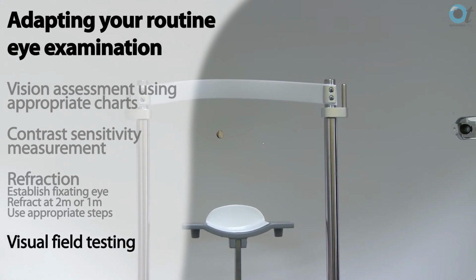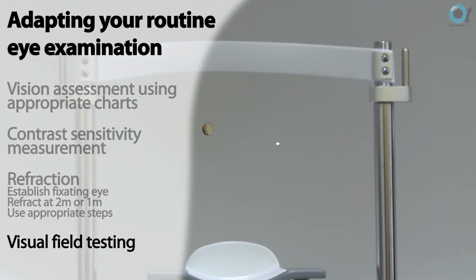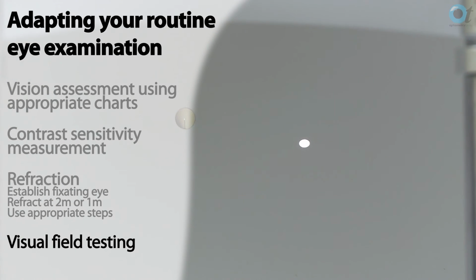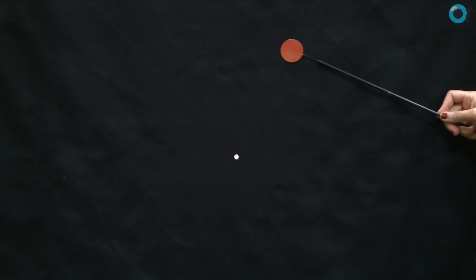We know that visual field testing can be quite a challenge with people that have reduced vision, and therefore it is important to consider using a larger spot size on automated field instruments, or even using a coarser field assessment, for example confrontation or even a tangent screen.